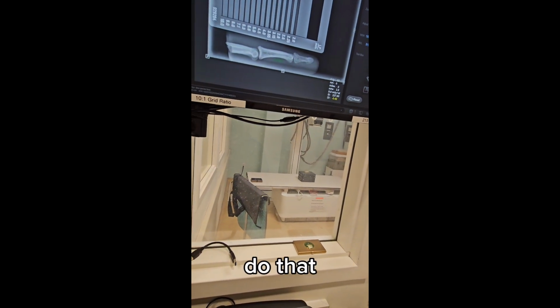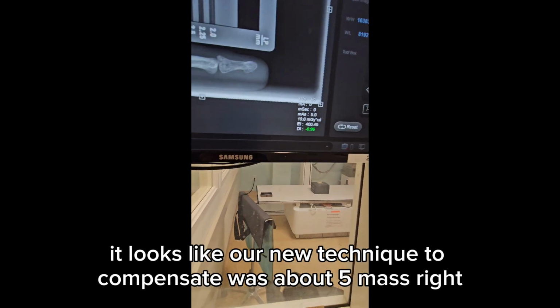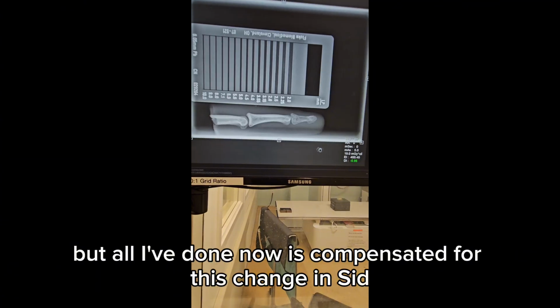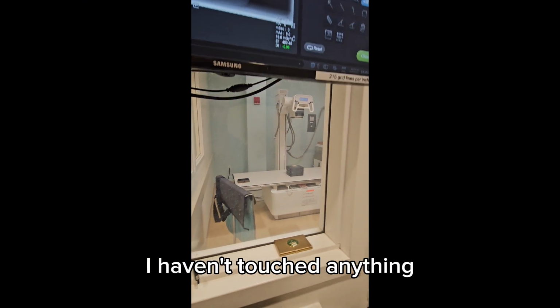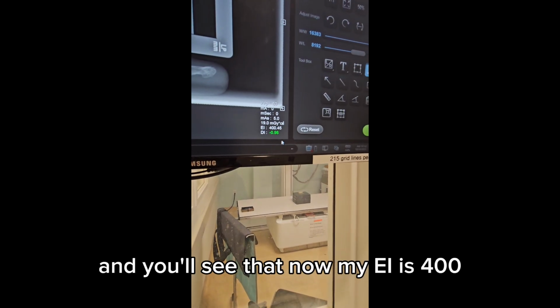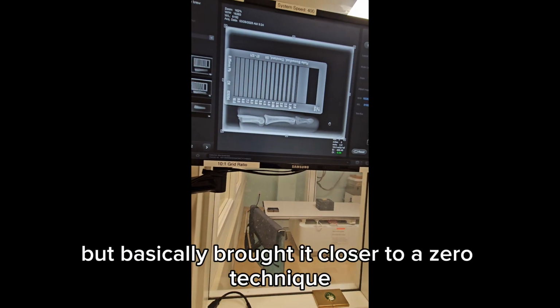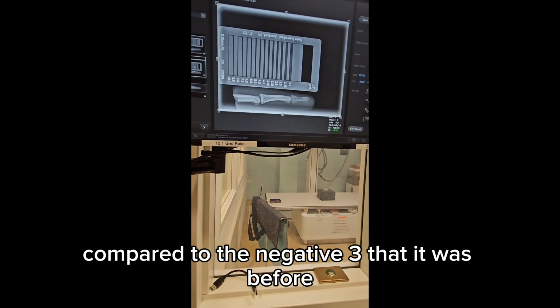Do that. It looks like our new technique to compensate was about 5 mAs, right? I'm not sure 100%, but that's okay. But all I've done now is compensated for this change in SID by doing direct square law. I haven't touched anything. All I've done is change my technique. And you'll see that now my EI is 400, my DI is still a little underexposed, but I do still have that large OID that I haven't compensated for. But basically it brought it closer to a 0 technique compared to the -3 that it was before.